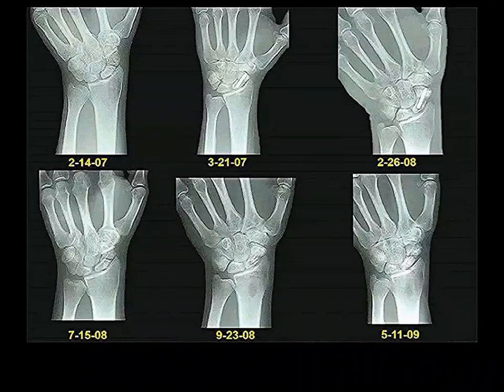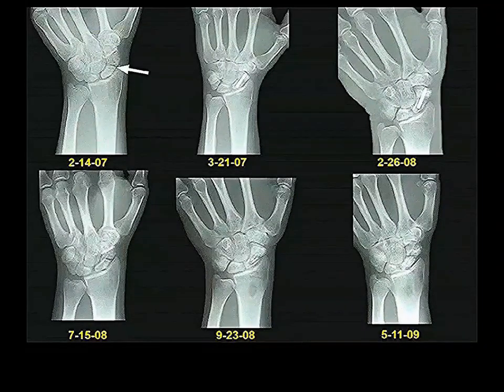Different case. Here's a person who has, let's look at our bones. Here's pisiform, this is triquetrum, that's lunate, that's capitate, that's scaphoid. Right. Here's trapezium up here, and it's overlapping the trapezoid, so I don't see it so well. This person has a fracture right through the middle of his or her, I'm not sure which, scaphoid.